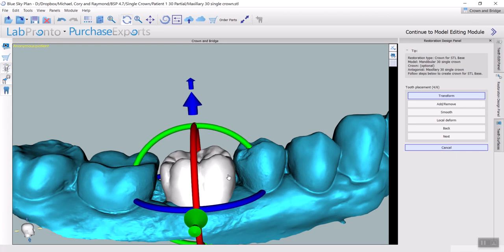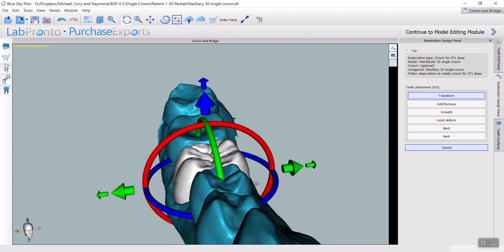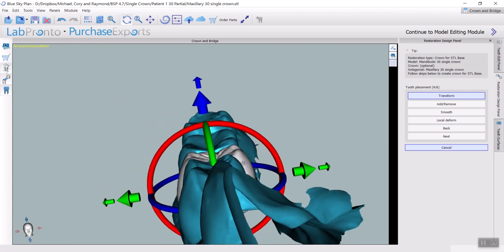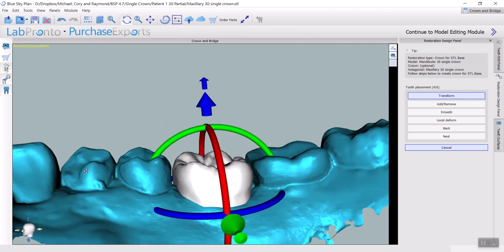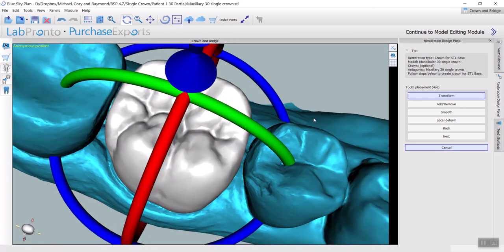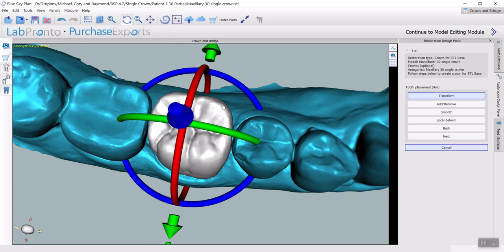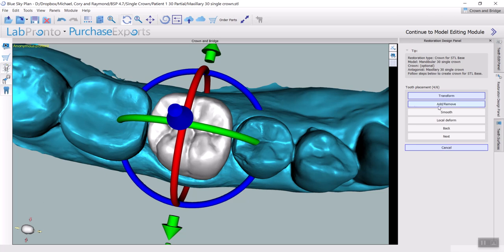Okay, center the crown in that plane, and then after you have placed the tooth in a clinically acceptable shape, you can use the rest of the tools that we have in the wizard, which are very useful. So here I can say that it's now perfect, and then we have different forms.